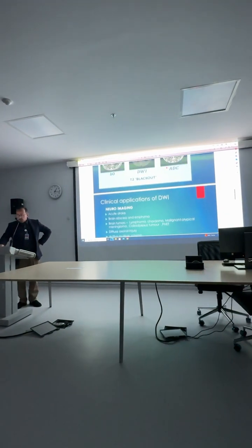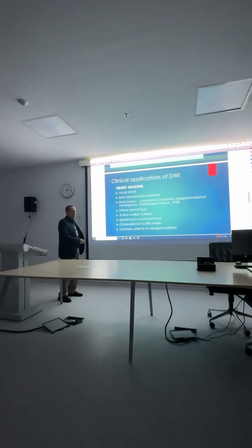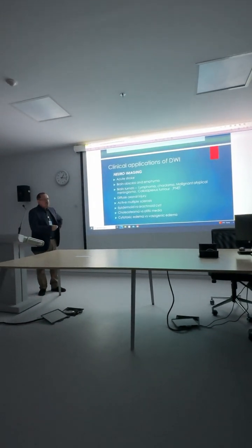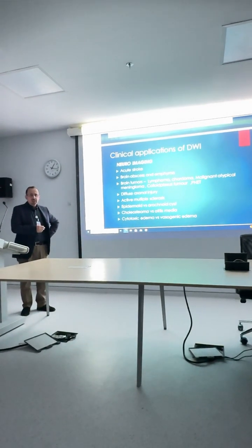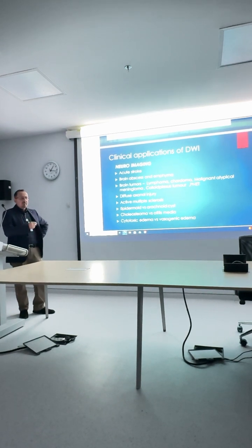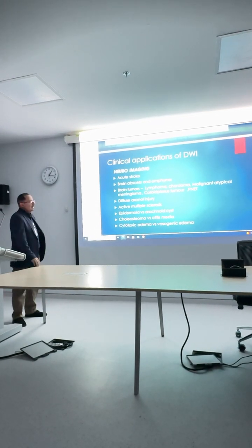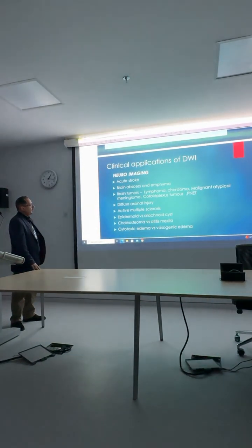Now we will go to the part which is very important for practice in dealing with DWI images and ADC: the clinical application of DWI, which is nowadays becoming increasingly important. We start with neuroimaging, which is basically our talk and the most common use for this type of sequence.